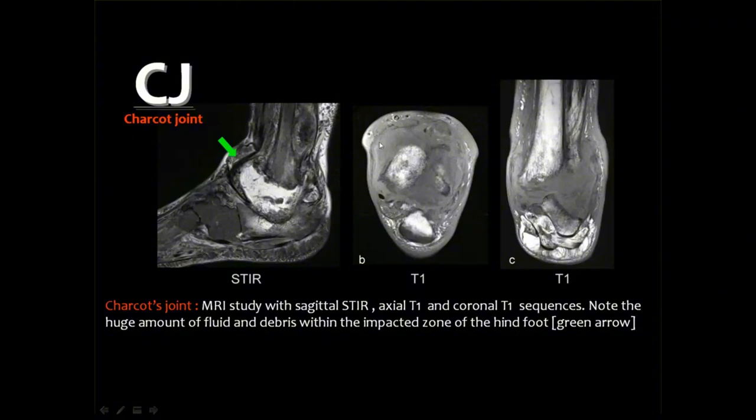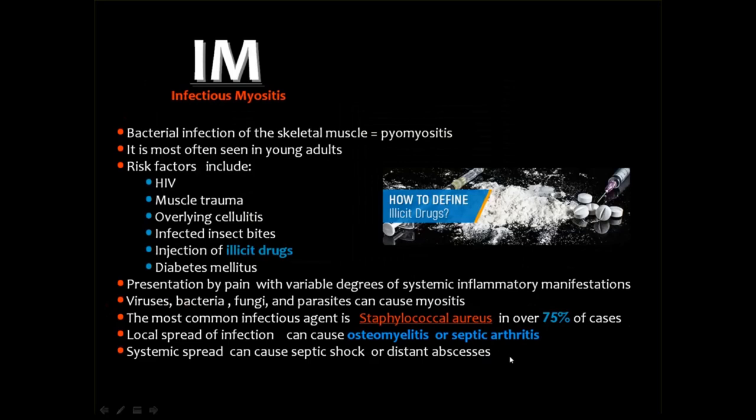You got soft tissue inflammation with phlegmon formation, let us say that. And one of the best values of this MRI is to detect well-formed abscesses, and they are of interest for the surgeons to be evacuated either in the diabetic foot or in the presence of Charcot joint. Then we have some few remaining issues about the inflammation of the muscles and the inflammations of the skin.